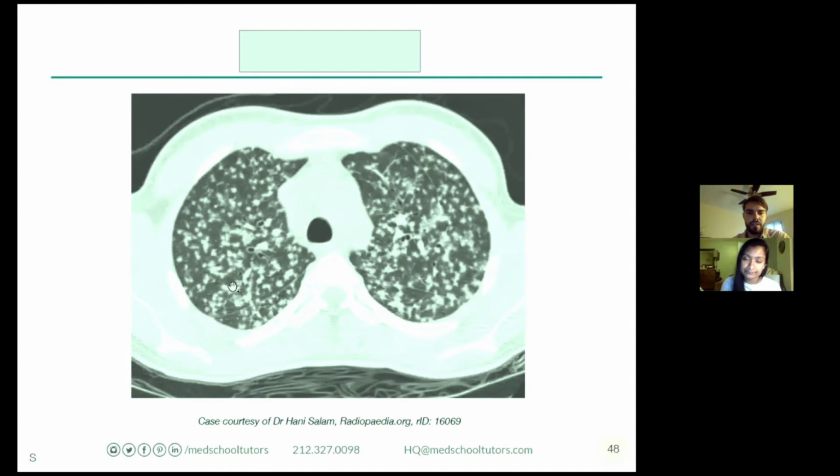Okay. Take us through another one, Sana. Another one. This one's a little harder. Let's see how you guys do with this. So again, looking at the lungs, axial slice. Oh my God, some people are already getting it. Okay, never mind. It's going to have to be harder still.